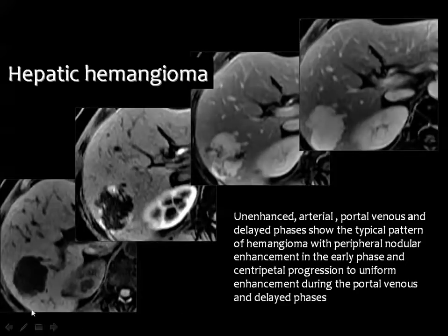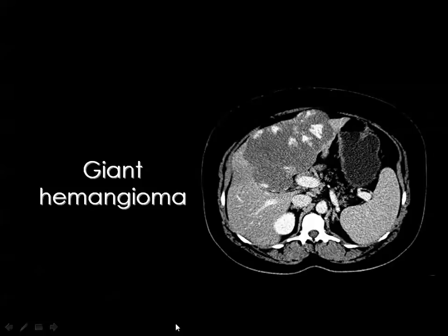And this is hemangioma, and you see that this is T1 and before injection of contrast, the cystic lesion, low signal, and after injection of contrast, you get nodular marginal enhancement and progressive filling of the hemangioma with contrast media. And I have said that the hemangioma, which is in the range of 6 to 10 centimeter in size, is known as giant.